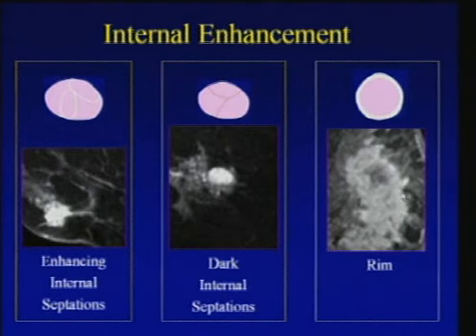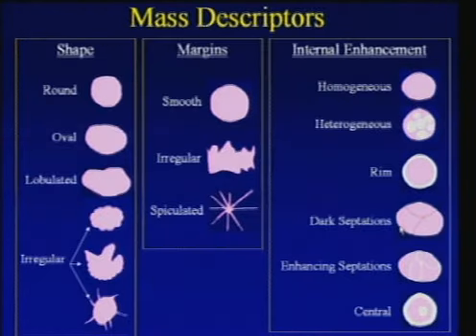And the last thing is this. This is a mass where it really is just the center which is not enhancing. So extensive clumpy peripheral rim enhancement in a large breast cancer. So at the end of the day, this is easy.